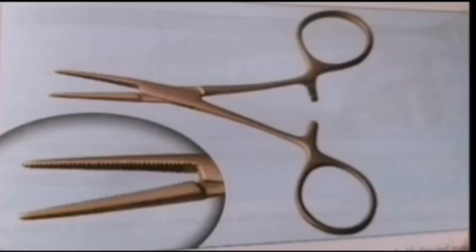What about the next one? It is an artery forceps, also known as hemostatic forceps. It has multiple straight grooves near the tip and a locking mechanism near the ring end. These can be straight or with curved end, right? So you can see the multiple straight grooves near the tip, and here is a locking mechanism. What's the use? It is used to catch bleeding vessels during the operation of the lids and lacrimal sac and to hold the skin and muscles during suture, right?